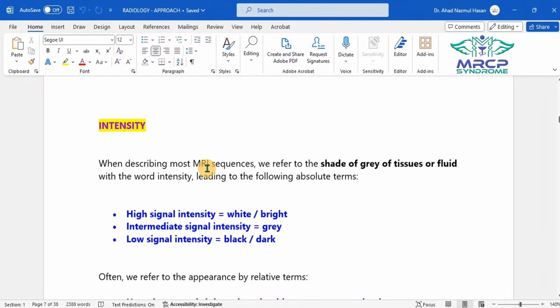This is known as enhancement. Enhancement is used to identify abnormal tissue, especially in case of tumor. Tumors have an increased blood flow, and this usually causes more uptake of the contrast material. So for the detection of tumors, we can go for the contrast MRI.